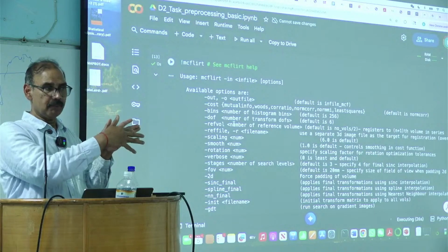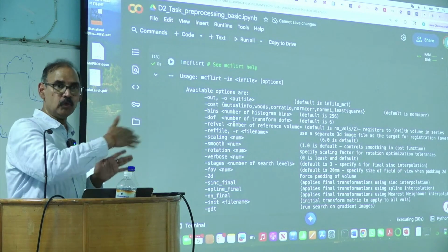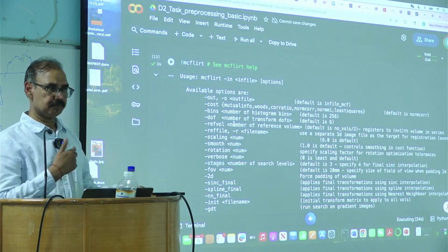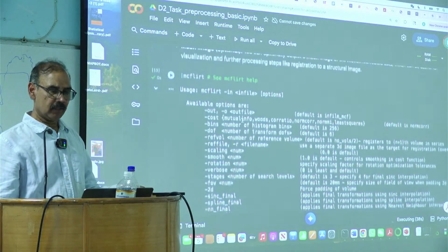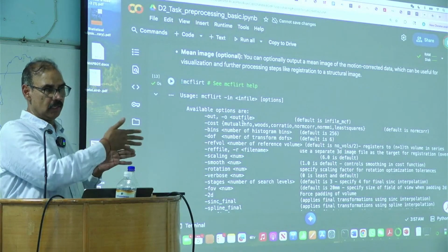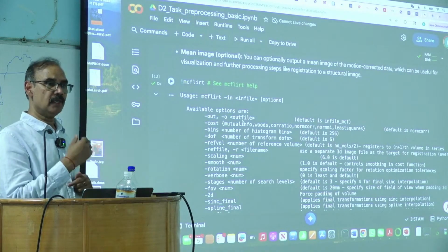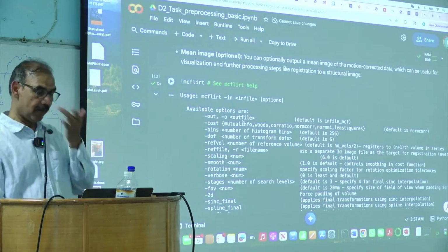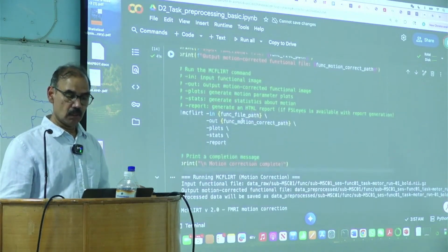Then you do it for number 3 with 1, number 4 with 1, and do it for, in this case, all the 818 images, right? And so that is for the functional data set, right? In this case, it's a linear or an affine transformation. So that is why it is fairly quick, okay?